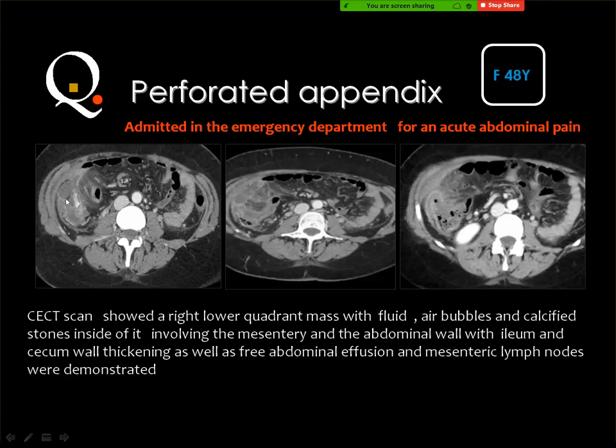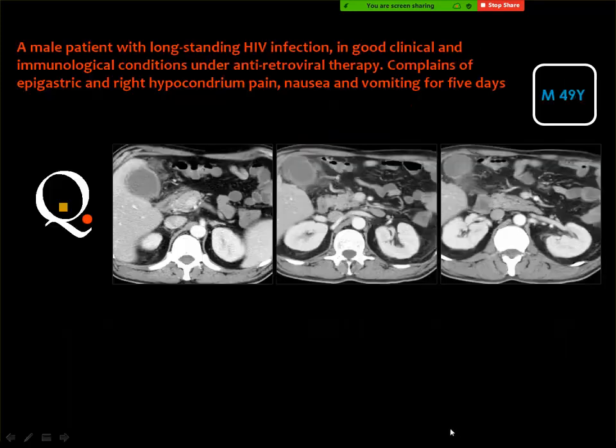And this is one of the pathognomonic landmarks of this lesion belonging to the appendix. And this appendicolith should be surgically removed whenever draining this abscess, otherwise it will remain and form a foreign body that will again accumulate infection.